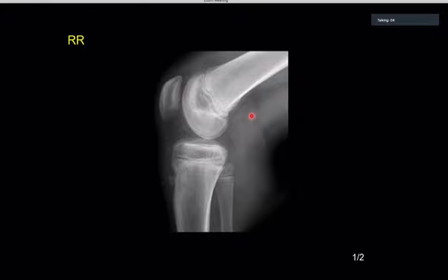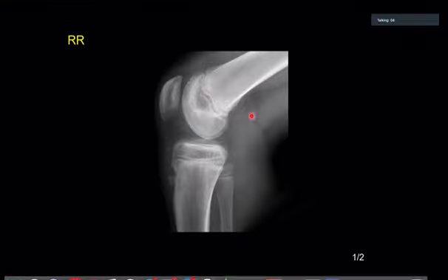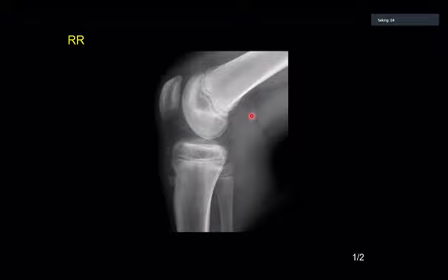Epiphysis at the anterior tibia, nor is there separation from the adjacent metaphysis. There is a little bit of increased soft tissue thickness anterior to it, but it's certainly not prominent. However, if the clinical features were very convincing, i.e. there was pain localizing just to the insertion of the patellar tendon, I might be willing to consider it.